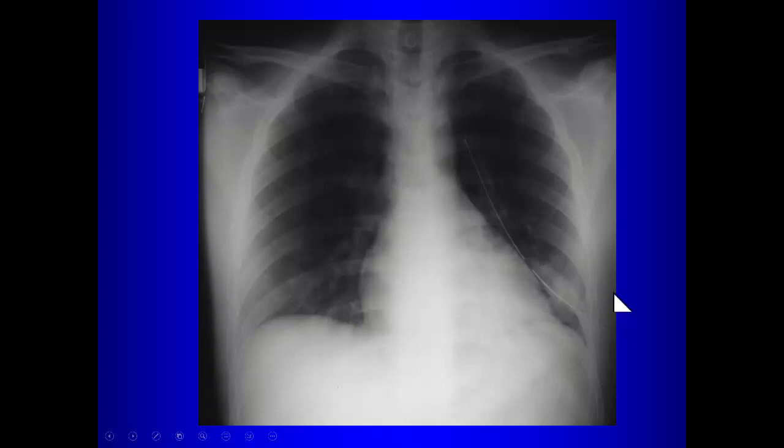If this is out here in the soft tissues, what can happen? Well, you can get an air leak, so you won't necessarily drain a pneumothorax or whatever it is that you want to drain, okay, because you can get an air leak. Also, the pleural space should remain sterile, and that can be a portal of entry for bacteria to get into the pleural space. So you want to make sure that this is on the inside of the rib cage. You want that in the pleural space.